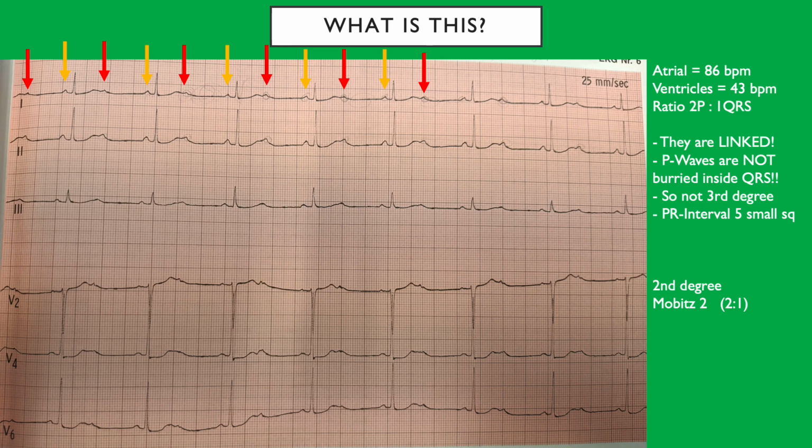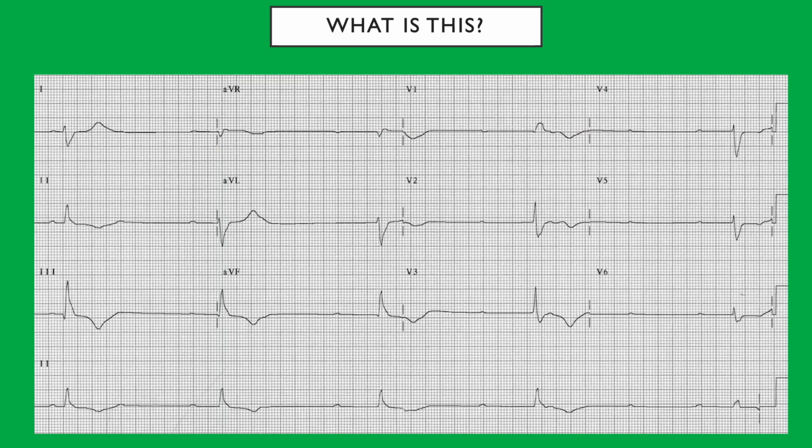Just to make sure that you look at the whole line, okay. Try to find all the P's. And yeah, so what is this one? Now you're not confident in your answers anymore. Okay, so third degree. Yeah, this one is the third degree.